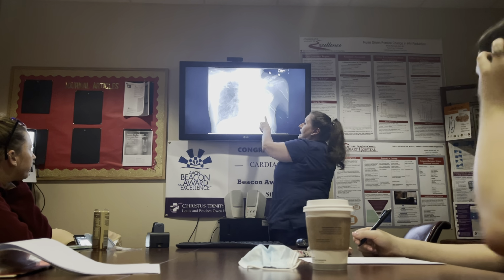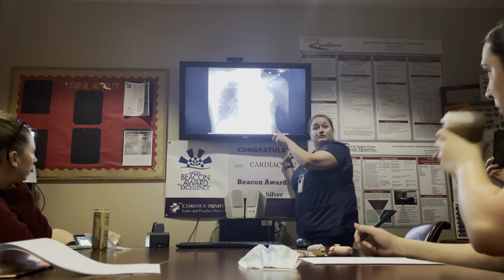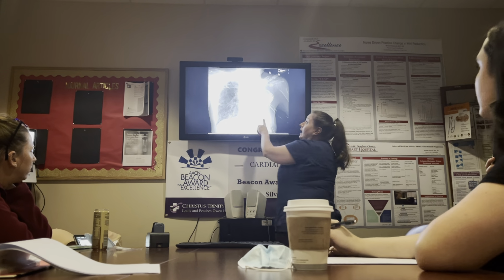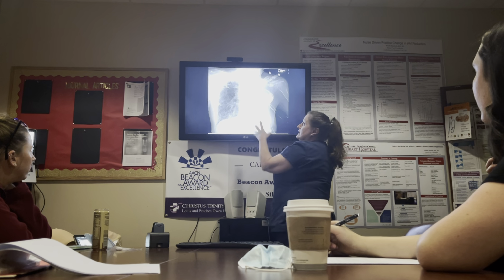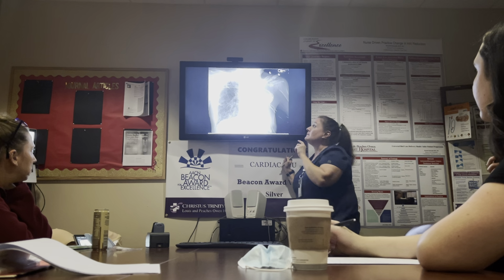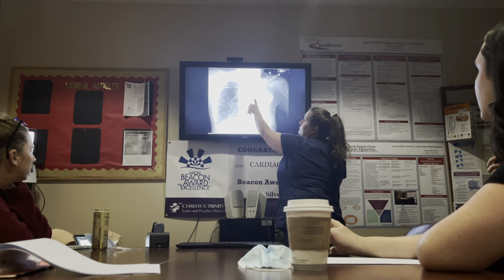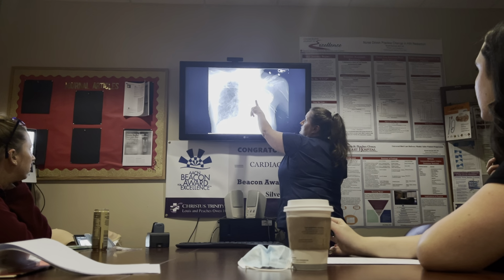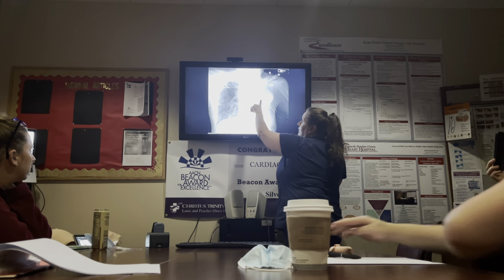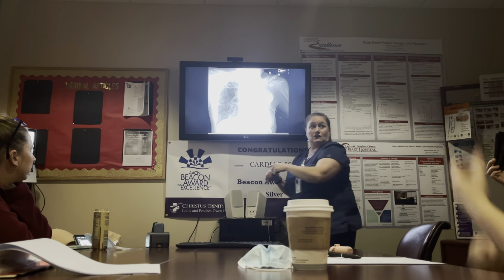It could have been a bullectomy, you know, the lung reduction surgery for bad emphysema. It doesn't make sense with all the staples otherwise, other than to be maybe a bullectomy or a lung reduction surgery, because again, you kind of see the stump of the bronchus over here, and you see the air here, which is the actual lung, but that's just the edge of the lung.